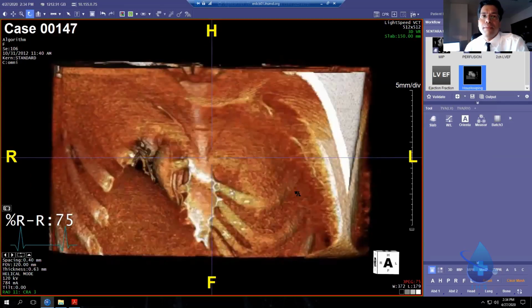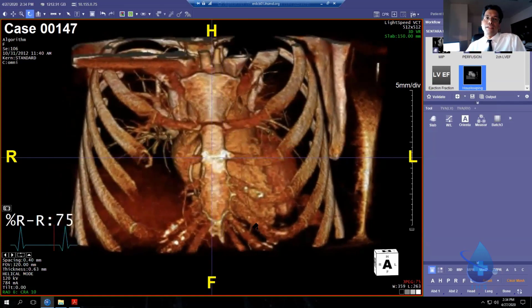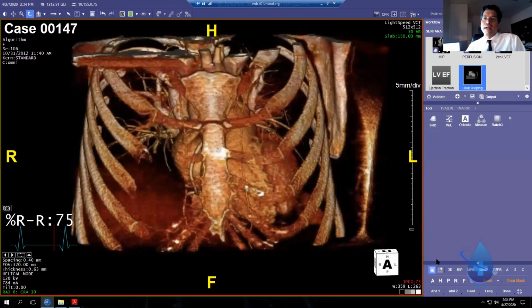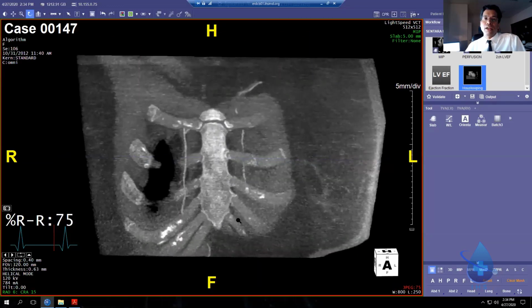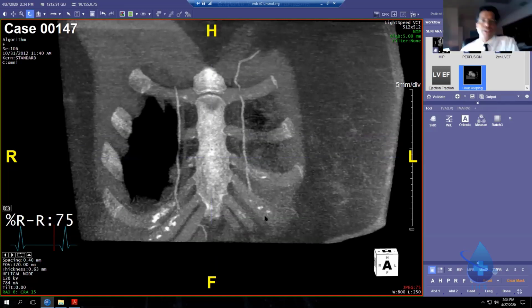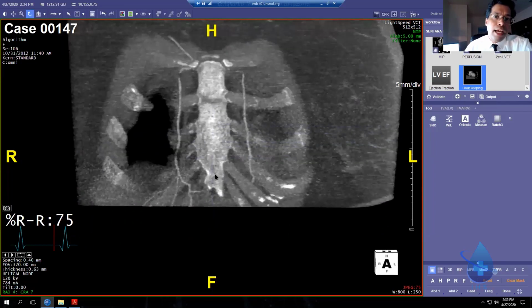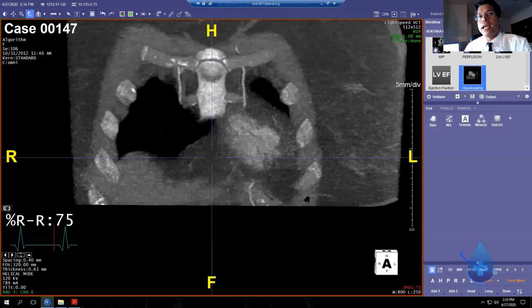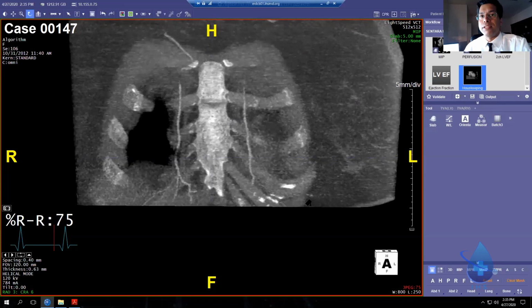So let's review some 3-dimensional anatomy. When I cut in through the thorax here, through the sternum, well, let me put it on a MIP for a second. Let me show you what I see when I look, okay? When I put the sternum in the crosshair on the MIP, I know I'm going to find the LIMA along the left side of the sternum here, and the right internal mammary artery along the right side of the sternum, okay? And so to look and see whether the LIMA or RIMA were taken down for bypass, this is the first place to look.